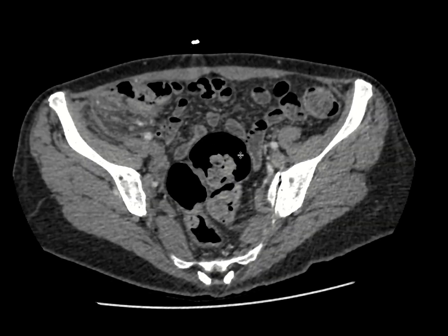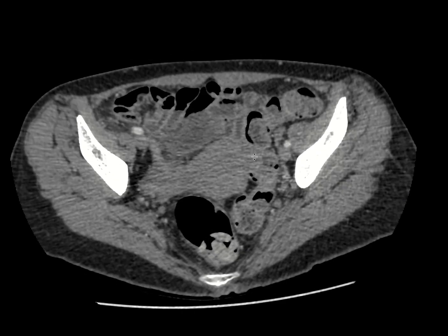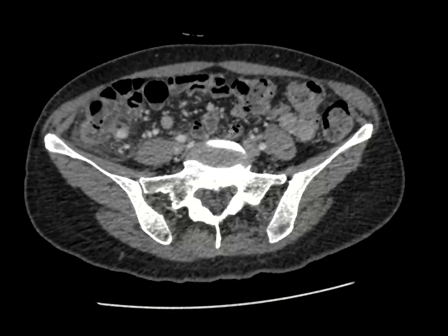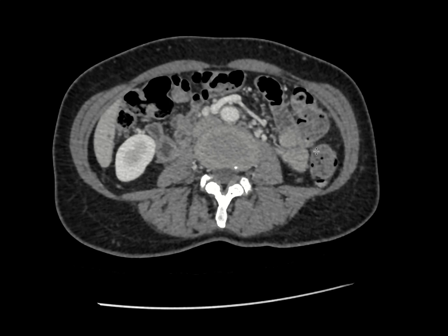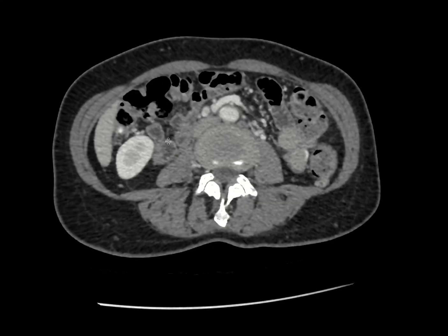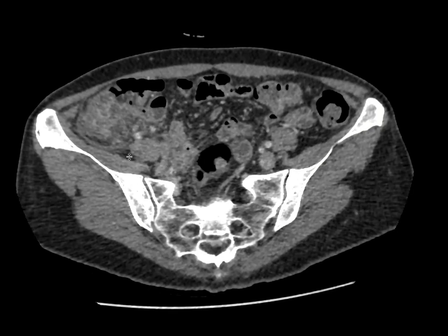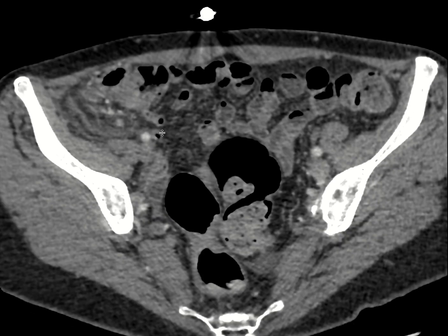Now, in most patients, diverticulitis is actually most common in the sigmoid colon. In this particular patient, there's no real sigmoid diverticula, and in the left colon, maybe there's a few diverticula that we can see here and here, but the predominant location of this patient's diverticula are in the right side, and so this patient has diverticulitis. We can actually see here the normal appendix.